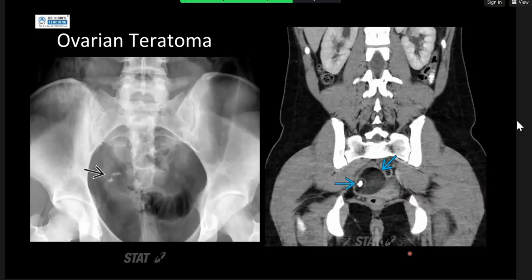Just going on a bit more, just because this did come up for me in the exams, I said earlier, and it shows you that there's some tooth-like calcification within there. And on MRI, it shows you nicely an ovarian lesion with foci of calcification. CT, apologies, CT showing you calcified with low density, so probably a mixed solid cystic lesion in there, or probably even areas of fatty components where the areas are more hypodense. Okay.